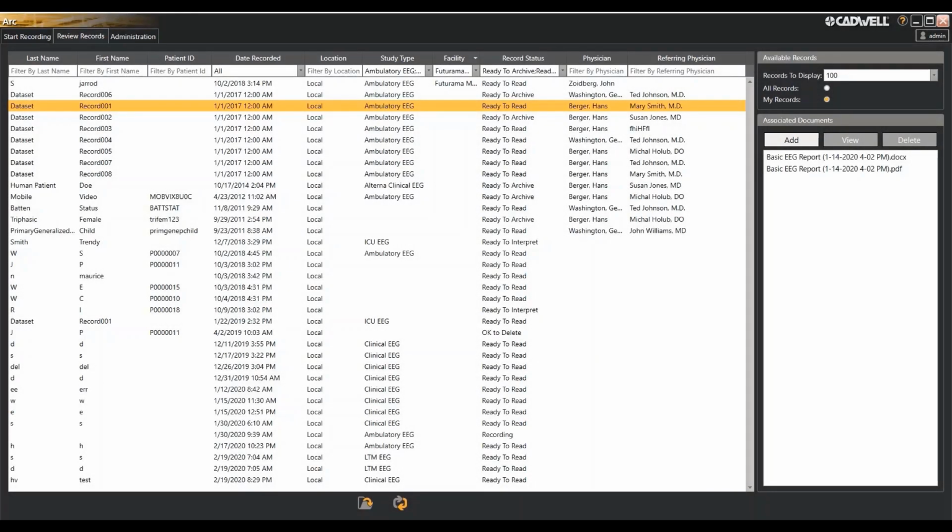Welcome to Reviewing Studies, in particular navigating through a study. The purpose of this video is to show you how many different options there are for navigating through a study. Other review functionality will be described in subsequent videos, since there's lots of ways to navigate through this.